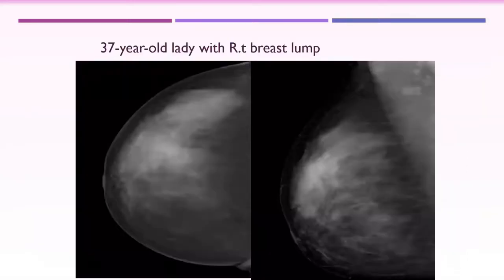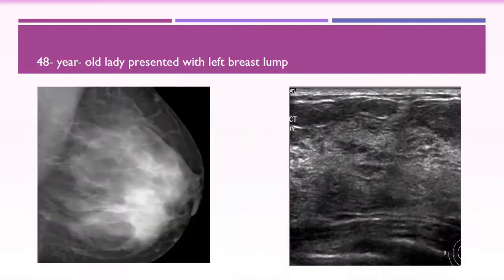There was a small cyst, a small micro cyst. On the previous ultrasound there were small cystic changes, micro cysts. Yes, but that doesn't explain the palpable finding.